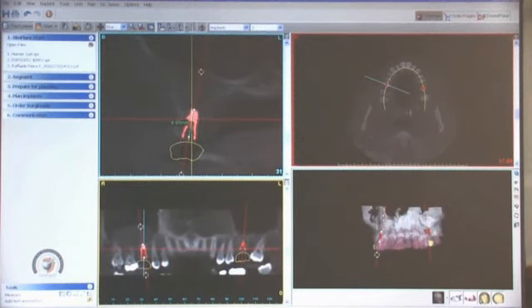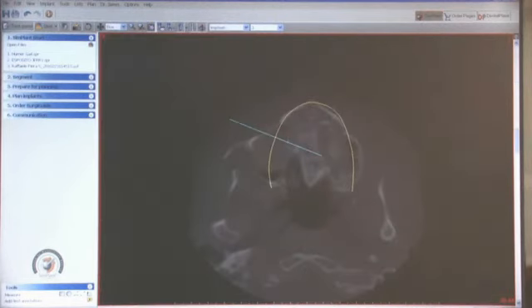If you go above it is the axial view, and we move this scroll bar, we can move up and down the axial slices. And obviously one of the first things that pops out in the axial slice, and I'm sure you're well aware of, is some kind of a pathology in the sinus. It looks like most likely a polyp or mucocele. And so it looks like you have a pretty large polyp on the patient's right side and a thickening of membrane on the right side. And go ahead and feel free to interject or jump in there, Tim.